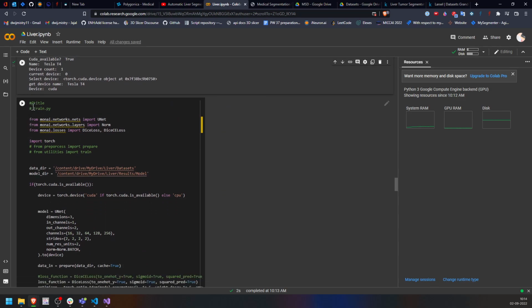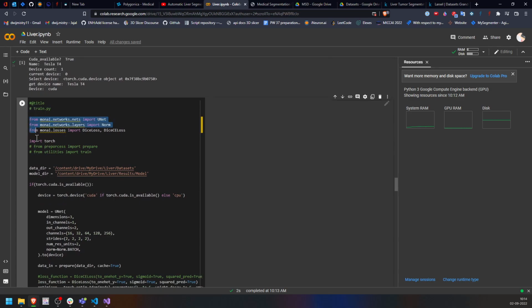Now this is the training part. Here again we are importing Monai, and this is very important. In the training part, this data directory and model directory is very important. So make sure what kind of data directory you are using. For this, I have used Google Drive.